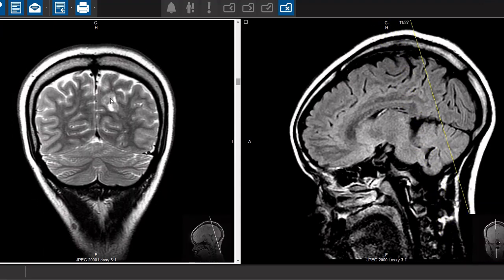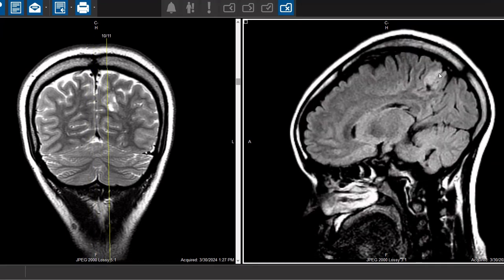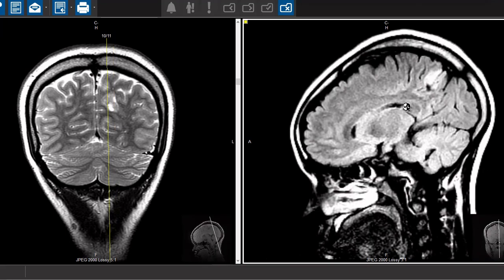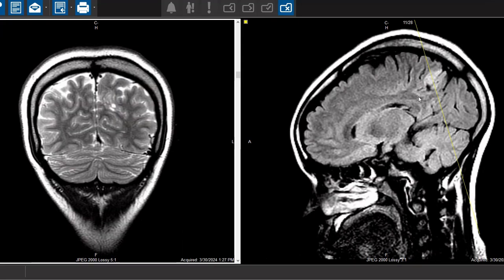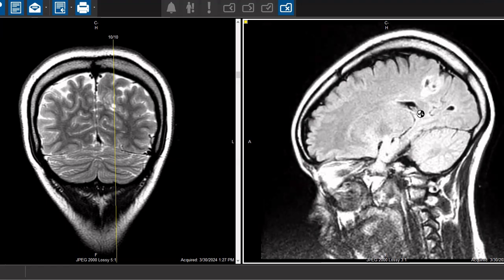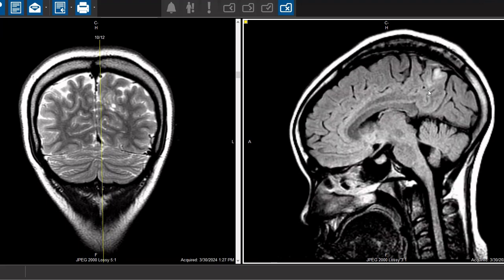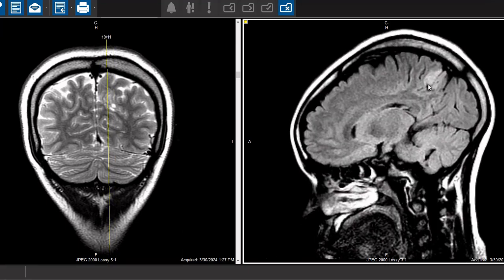And now in this patient, we do see something peculiar back here in the left. So this is the left parietal lobe, and we see something abnormal. So at first glance, it looks like, ooh, this could be maybe a tumor. Looks irregular, but looking at this more closely, there's no mass effect. It looks like there may be a little channel from the outside of the brain that goes down into this, and there's a couple little blips of low signal.